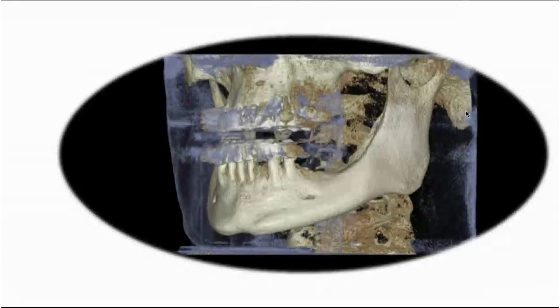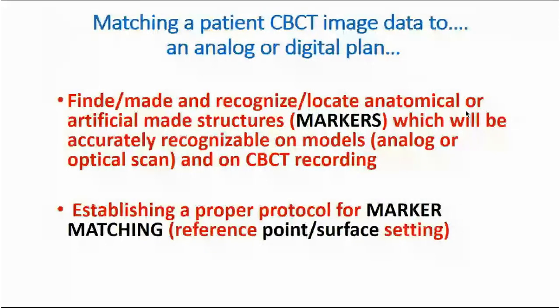We need to give some points or some surfaces which could be then recognized by computer and matched, so we could have reliable reference for our prosthetic planning or the production of the guides.